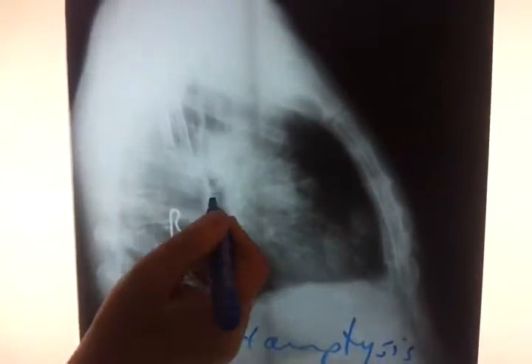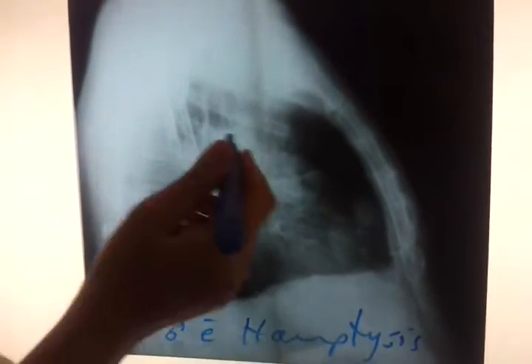This patient got a mass there and it turned out to be oat cell carcinoma. You see this rounded mass is there and spiky.